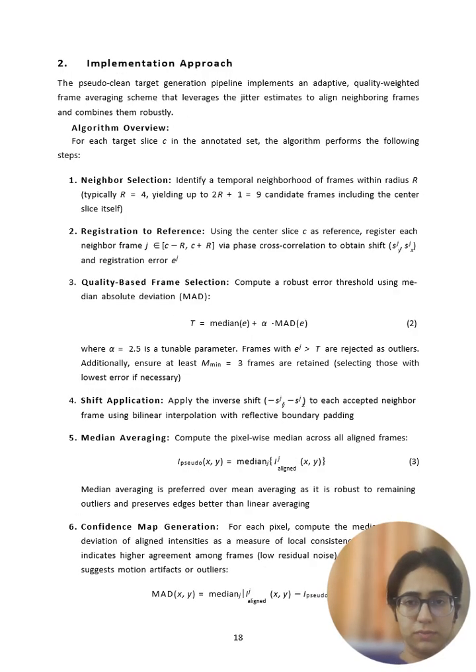How it's done is that we take one image and compare it with around nine of its neighboring images, like four back and four forward, and we use all those nine images to create one better image. We give our model code to use from 3 to 9 images to create one truer, better image. Usually we have used 9 images, and I've also talked about the mathematics behind it.